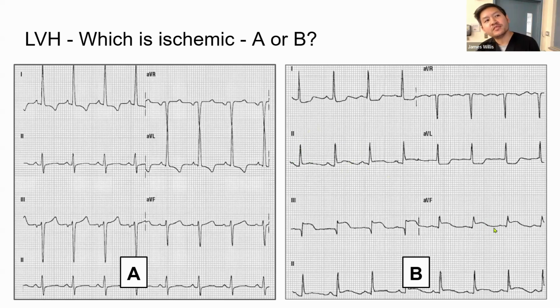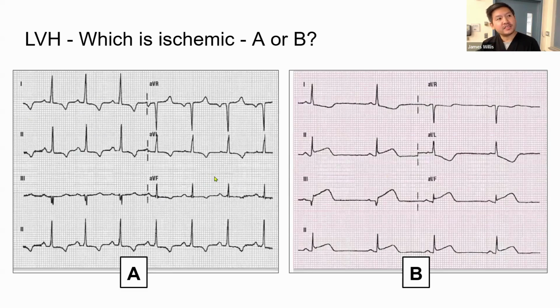AVF, yes, concordance. So bad. This one is probably an LVH pattern, very tall R waves with these curvilinear ST depressions here. All right, next EKG.